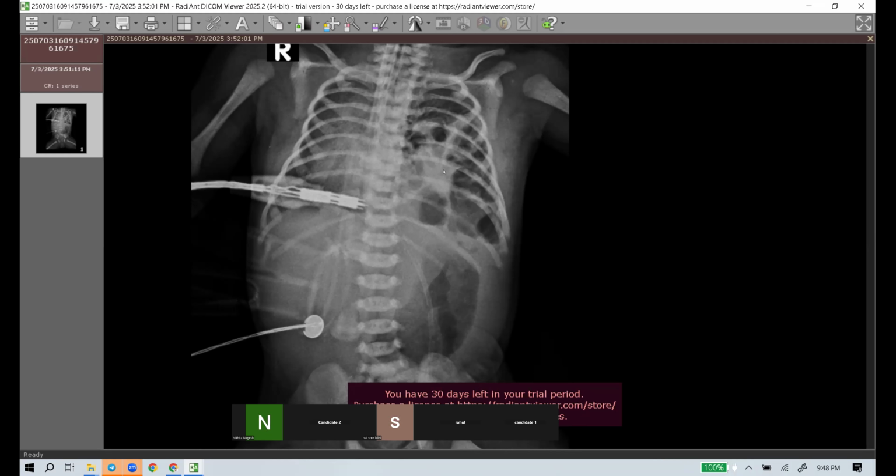After you mentioned all the lucencies, there is no diaphragmatic outline, and the left hemithorax is completely replaced. There is contralateral mediastinal shift, and that was all fine. You could have said firmly that I can't see the endotracheal tube separately from the nasogastric tube with the oblique position of this radiograph, but wherever I'm seeing the end of the endotracheal tube, this appears to be low for this kid, and we would do a repeat radiograph to confirm the tip of the endotracheal tube.